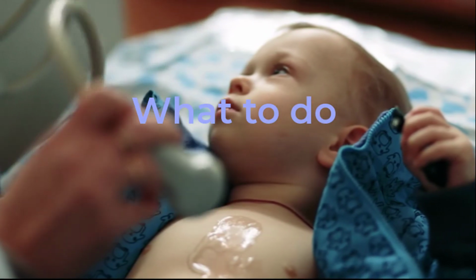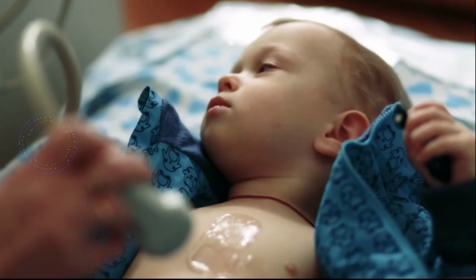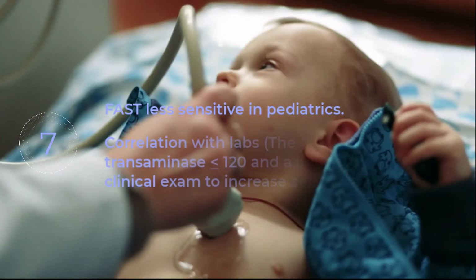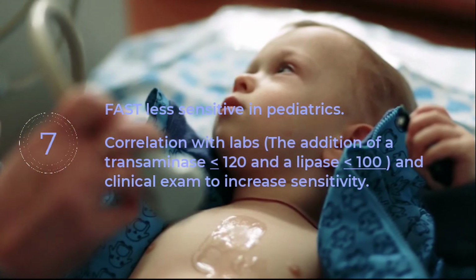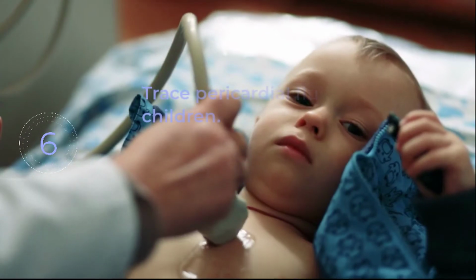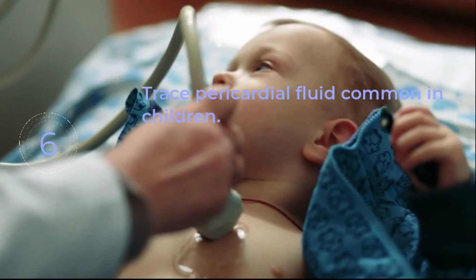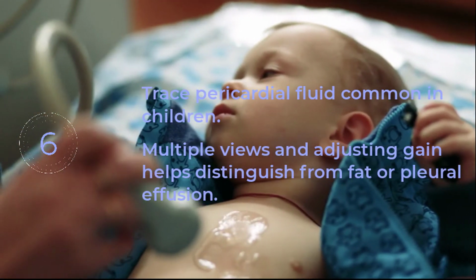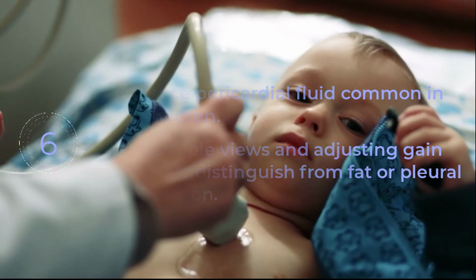Now that we know how others have modified the FAST exam to make it work better for pediatric patients, let's recap what we've learned. The FAST exam is less sensitive in pediatric patients. Combining it with reassuring lab work and serial physical examinations improves the test's sensitivity. Many healthy children have trace pericardial fluid. Obtain multiple views and turn up the gain to ensure that what you are seeing is pericardial fluid and not a fat pad or pleural effusion.